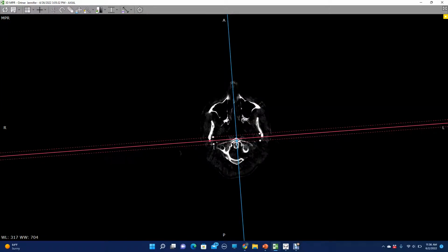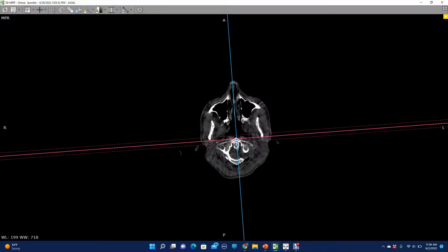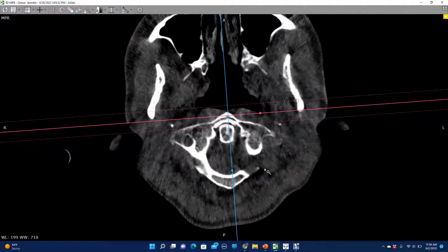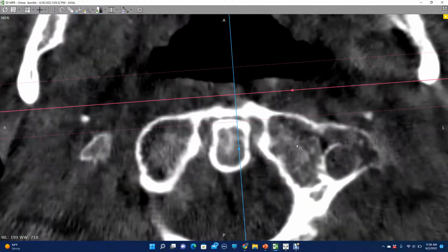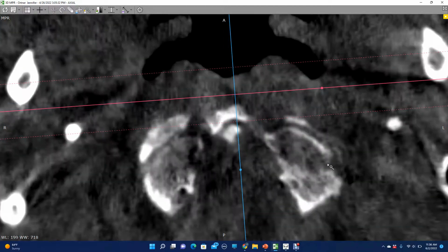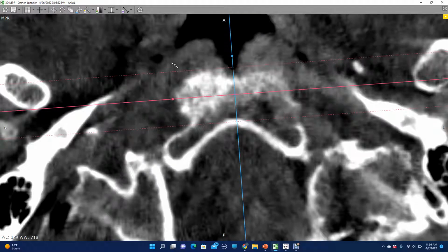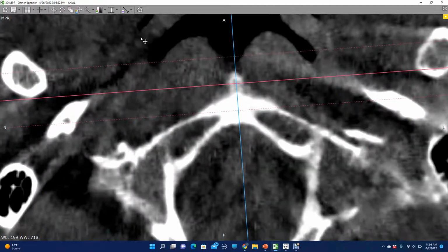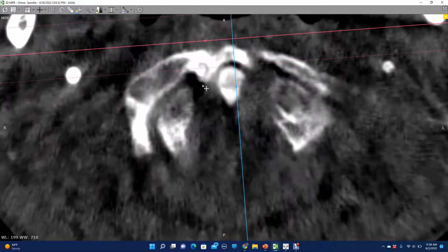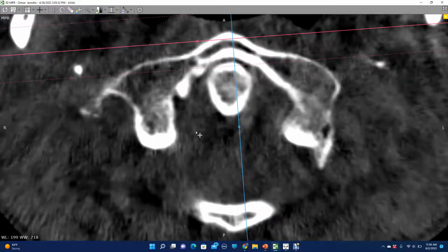And so now as we descend through her skull, right, there's the bottom of the atlas, there's the top of her atlas, and here's the floor of the occiput. So let's roll till we can see her superior, posterior, lateral masses. That's all condyle. Here's atlas appearing, and there it is, the back of that joint.